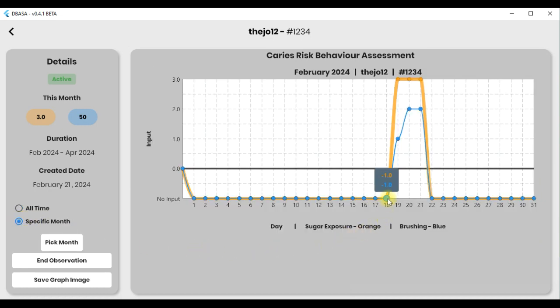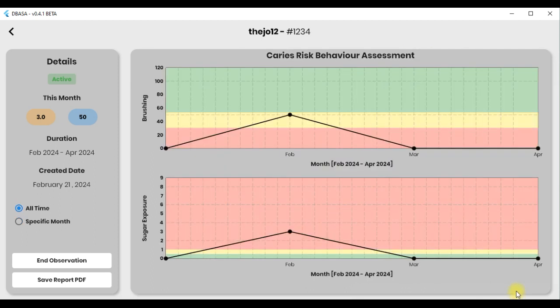In the period graph, that is this month, you can see 3 days of data has been received. That is 2 days passed from today, and today's data can be entered successfully. These are the basic functions of the mobile and desktop applications of the Sudanta patient monitoring system, which we are trying to present today.